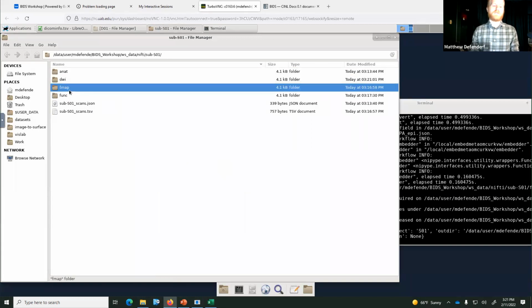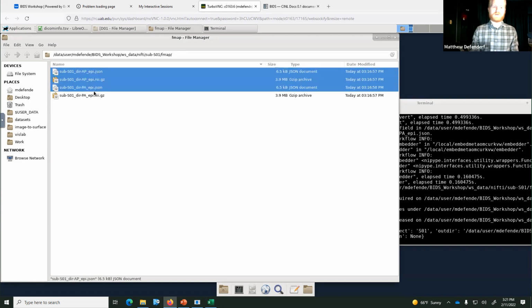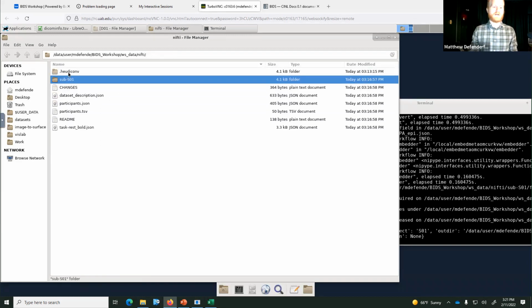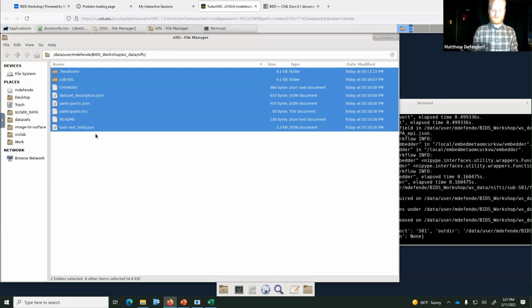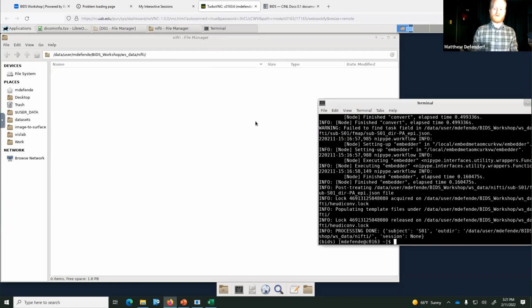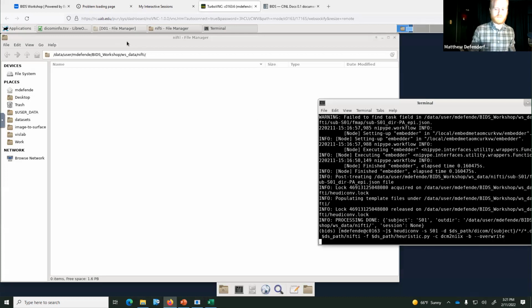And then you would have the field map. So the field map, you have the AP direction, the PA direction, and then their corresponding JSON files. Okay. So we only had 2 spin echo field maps. We've got 2 of those scans as well as the corresponding JSON files. So I'm actually going to go ahead and I'm just going to delete all of this real quick because I messed that up, and it's just going to be easier since we only have one subject here. It's just going to be easier to delete everything and rerun it. We've saved the heuristic, so it should be correct this time.